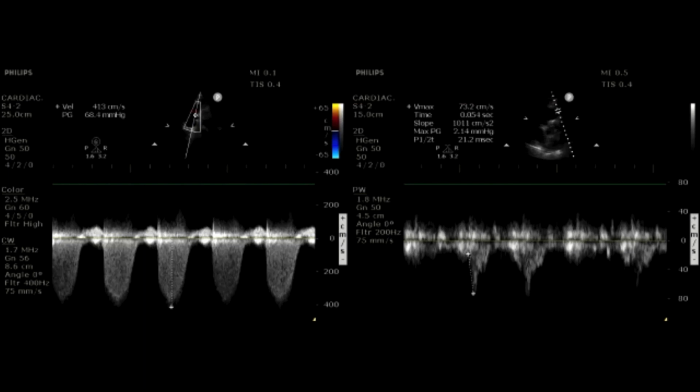The one thing we ought to remember is that in patients who are very, very sick acutely, there's a significant shift in the right ventricular stroke volume with every beat, right? So in patients that have a pulsus paradoxus because of significant pulmonary dysfunction, you can sometimes see a marked variation in the tricuspid regurgitation jet velocity as a function of breathing, right? So in patients who have really significant pulmonary hypertension because of lung disease, with inspiration, the right side fills, and you'll see a much higher TR velocity. With expiration, the right side kind of empties, and you'll see a lower tricuspid regurgitation velocity. And this difference becomes very marked in significant COPD or asthma exacerbations.